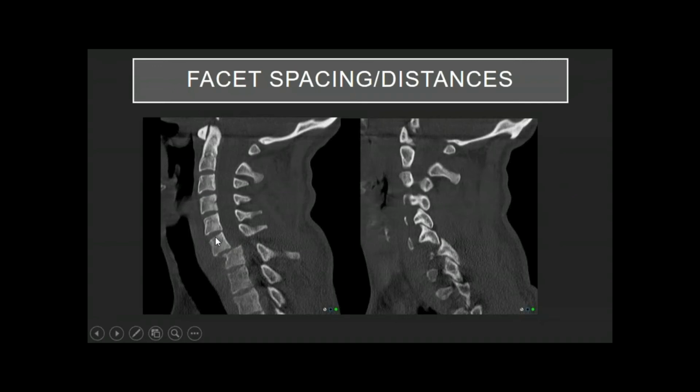So look at this. This vertebral body has a large amount of traumatic listhesis over this vertebral body, which means the poor spinal cord in here is getting completely squished. And this is the patient that suffered paralysis after this trauma. Again, you have a facet that actually jumped the facet below it and is now stuck on this facet, and it's caused the whole spine above this area to be pushed forward.